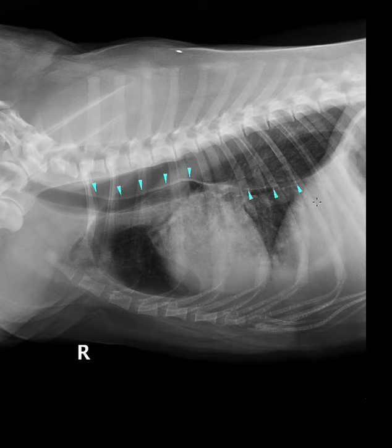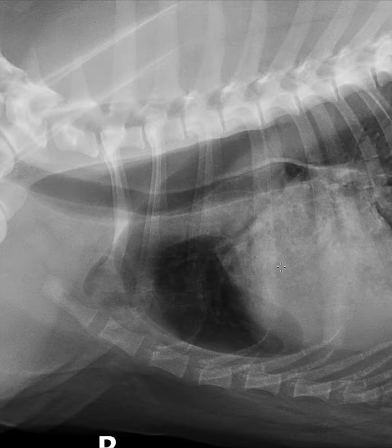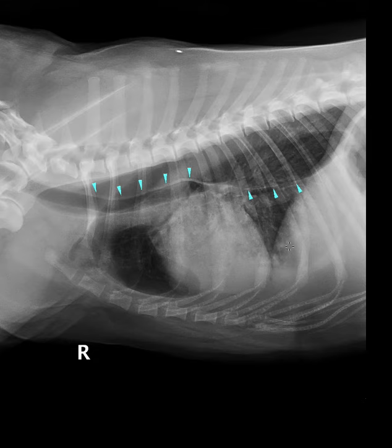So we see the esophageal wall here, just dorsal to the caudal vena cava, which is this soft tissue opacity here. The ability to see the esophagus caudal to the heart on the lateral views is variable. Occasionally, especially on a left lateral view, you will see the esophagus caudal to the heart, but you should not see the dorsal esophageal wall this high up.